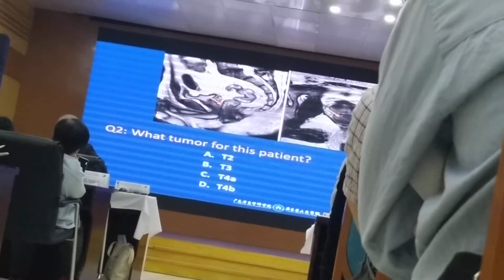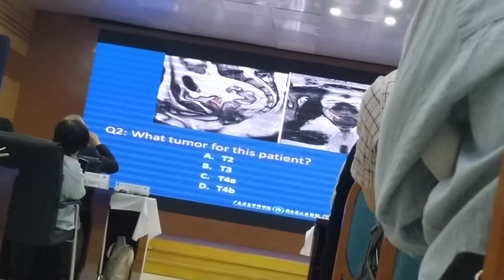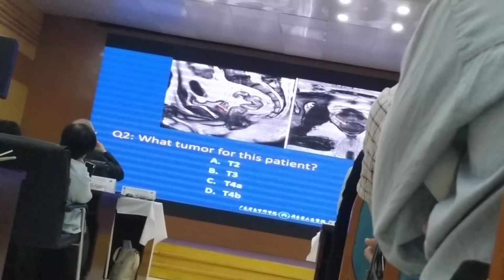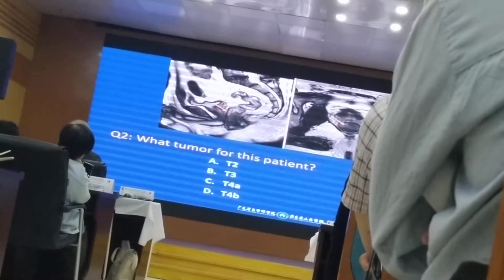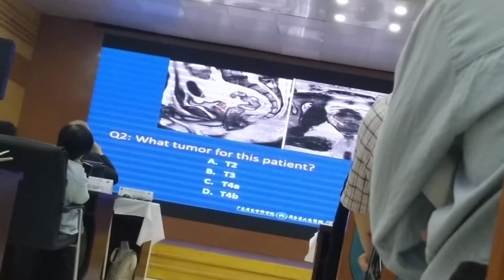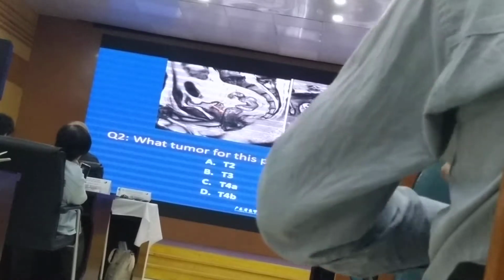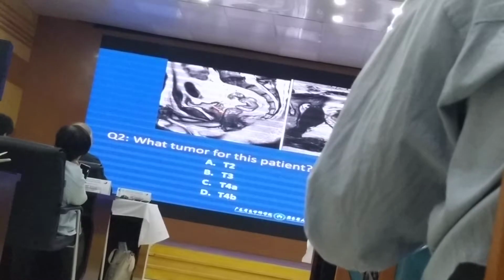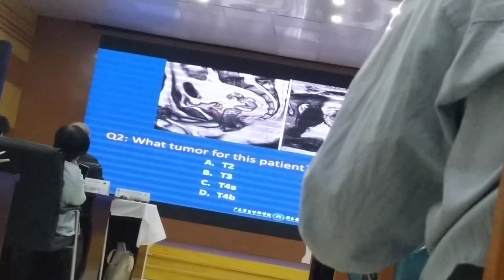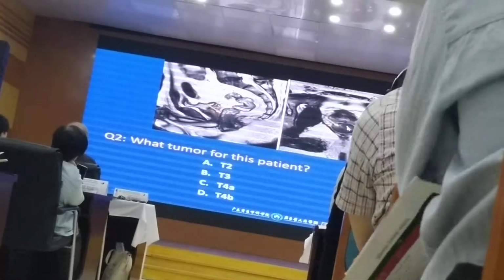The T2 is right. From this image, we can see that the rectal cancer lesion involves the muscularis propria, but the rectal outer wall is clear and a partial layer of the hypointense rectal wall is still present. This layer is kept black.